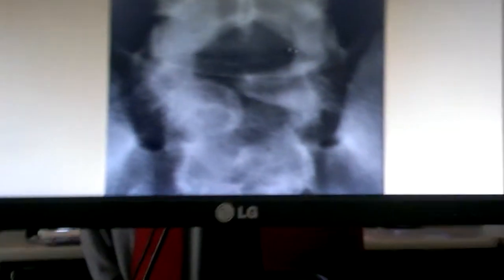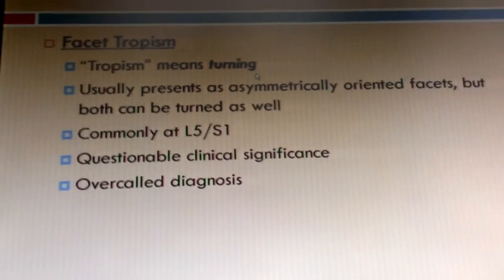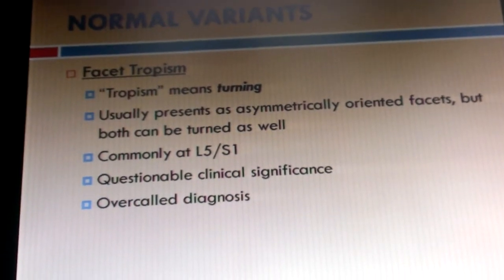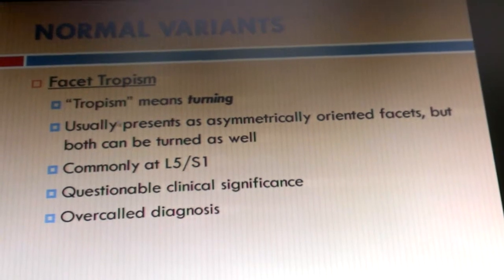90% of the time it's coronal, but here we've got the sagittal, so the one straight up and down. The tropism, again, somebody said it's turning, it needs turning. I don't know, I gave that person that said turning credit, but I don't know that I like the idea of turning.